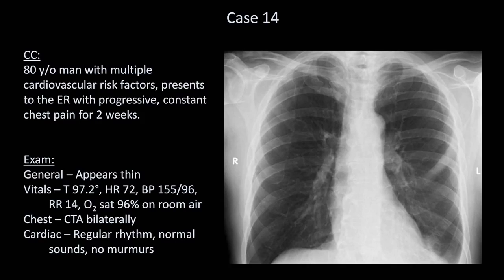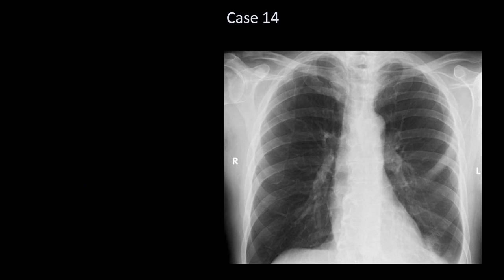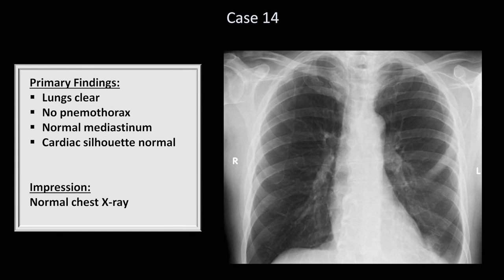Things like that. My guess is that 9 times out of 10, the ER doc or the internist who orders this chest film, in this context, would conclude that it's normal and then move on to admit the patient for a so-called rule-out MI admission.